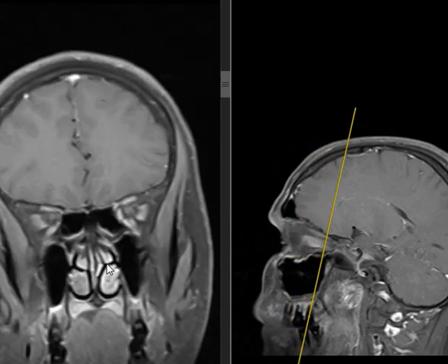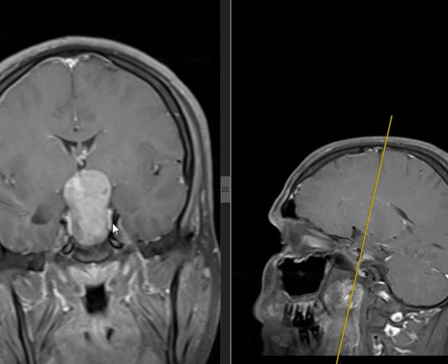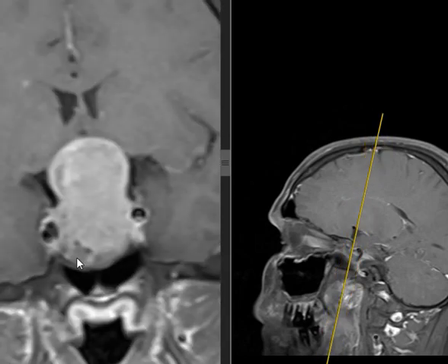Show me. What is the cavernous sinus and the internal carotid artery? This one and this one. Are they encased? No. Are you sure? Wait. Let me help you even more. Look at this image. Encased. The right side is definitely encased.